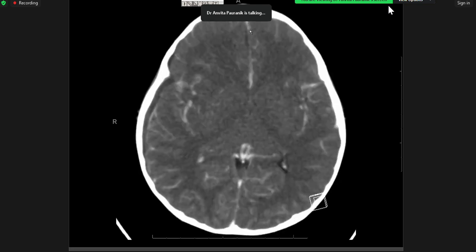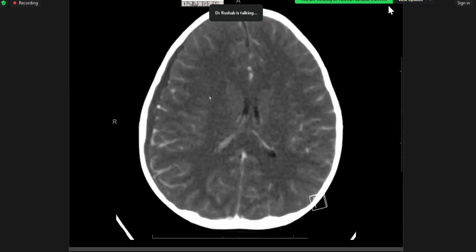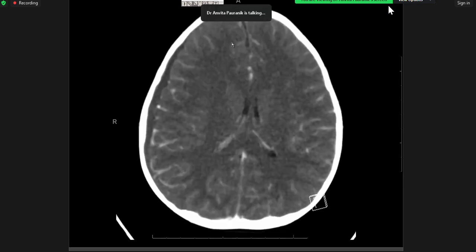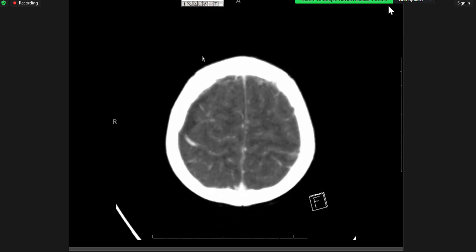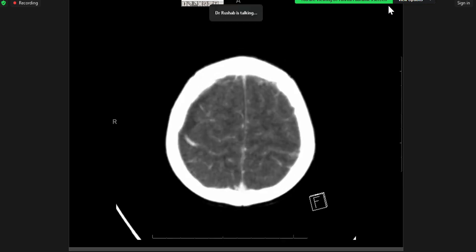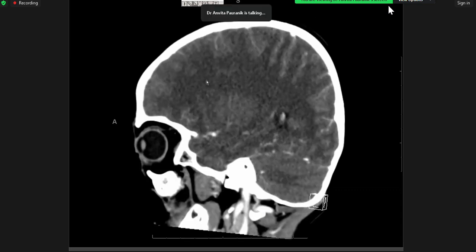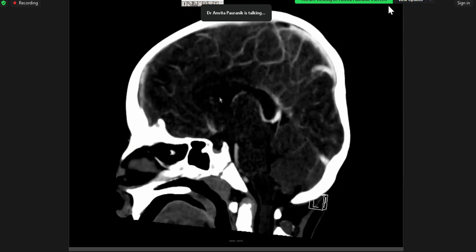And they can be hard, right? Sometimes, because what are the normal variants you can see in the venous sinuses, which can present as filling defects? Arachnoid granulations, right, some people had written. So how do you distinguish arachnoid granulation from a clot? The arachnoid granulations are peripherally based and they project into the sinus, ma'am. Yeah, probably more focal rather than linear and a longer segment. And sometimes it can be tough, right?